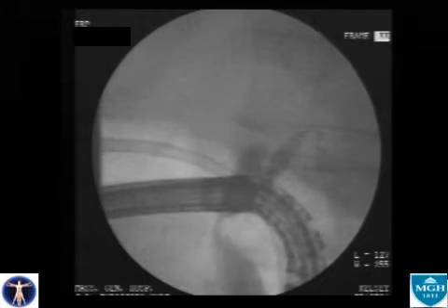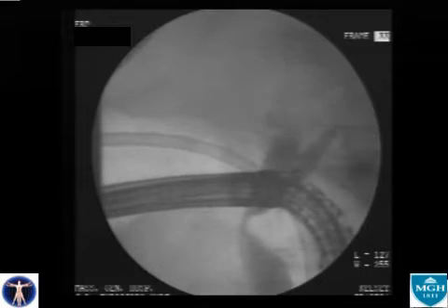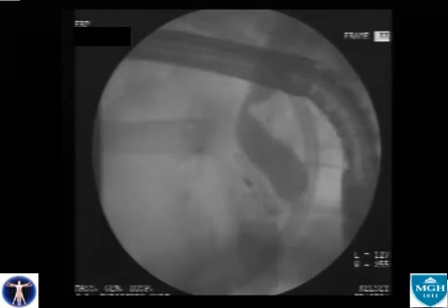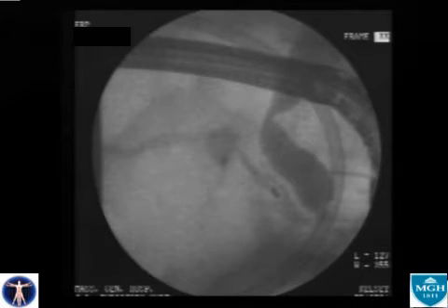We present here three examples of pancreatic duct fistulas. This first example is of a 73-year-old man who experienced gallstone pancreatitis complicated by necrotizing pancreatitis requiring debridement. Following debridement, he developed high output drainage from one of his surgical drainage catheters. The high amylase of the fluid and the surgical setting strongly suggested a pancreatic duct fistula.